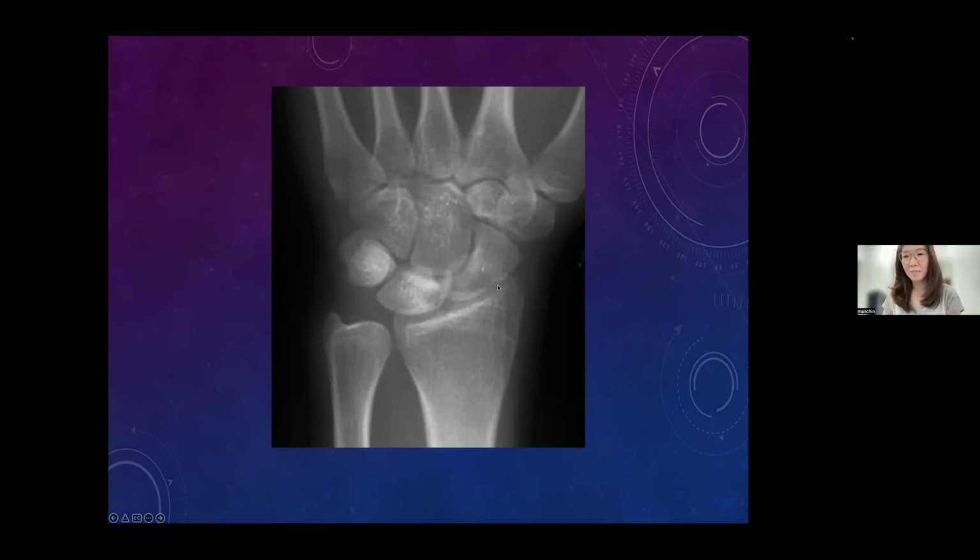So on top, just distal to the radius, what carpal bone is this? Oh, this one I really cannot. Okay, Dr. Elena, come. Scaphoid. Okay. Good, Jachi. So this one, after scaphoid, lunate. Okay, scaphoid, lunate. And then here, triquetrum. So that will be a pisiform overlapping on the AP view.